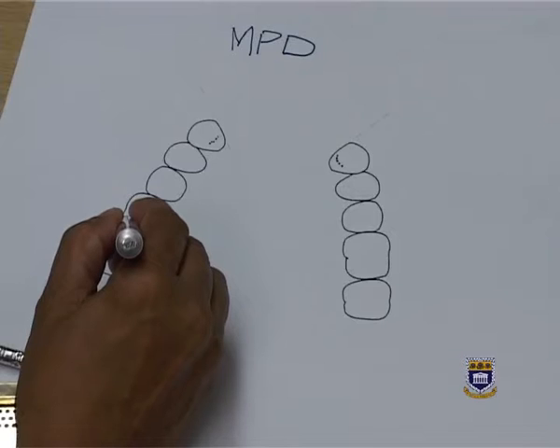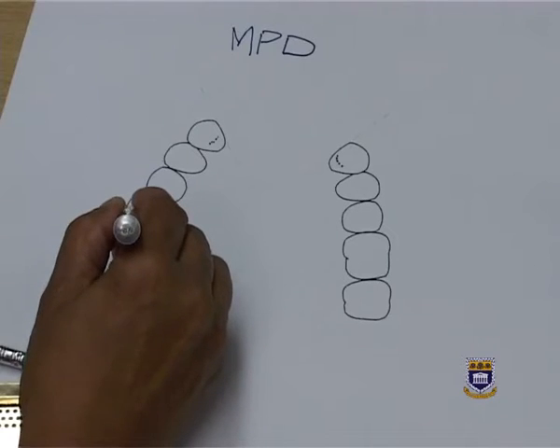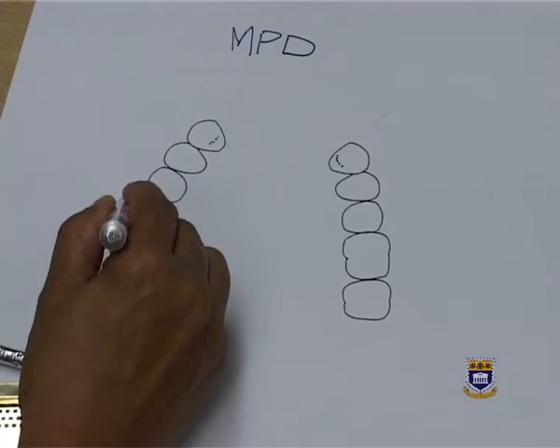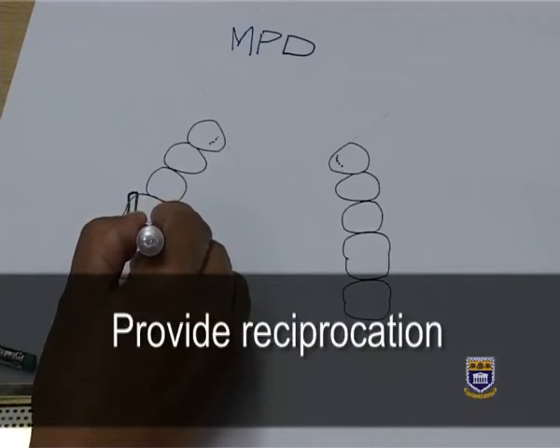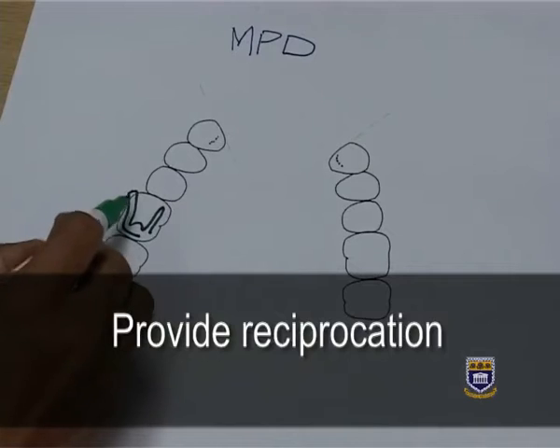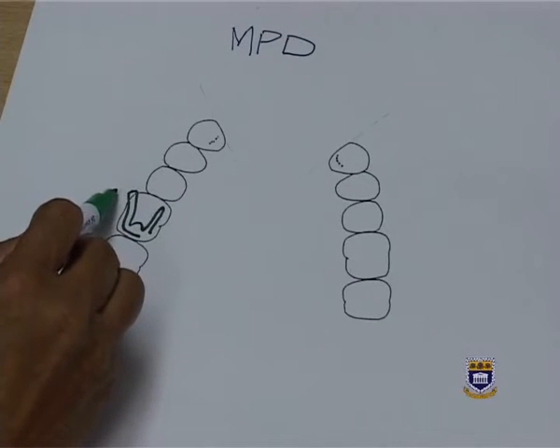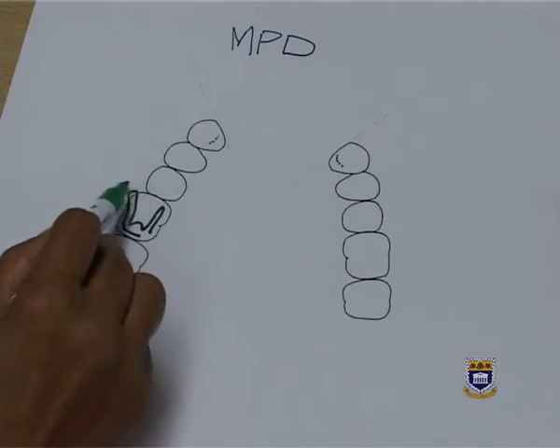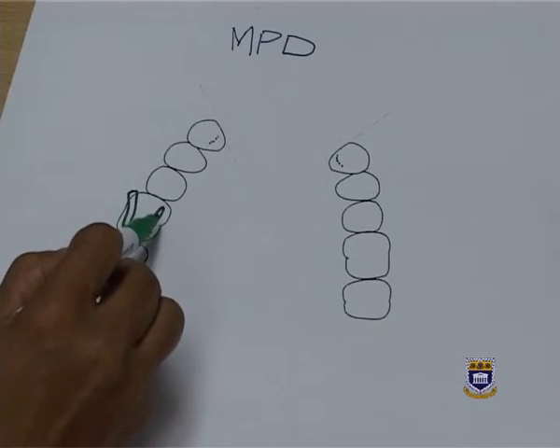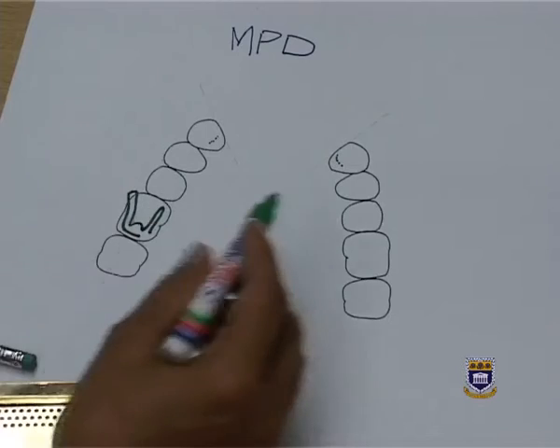The way I'm indicating it is that I'm using a distal rest, my active retainer that will engage the undercut again, and reciprocation again, tweedledee, tweedledum, my active retainer, which is in the undercut area, and my reciprocation that I must provide. And the circumferential clasp, because it's chrome cobalt, has its own rest, so they have 3 rests.